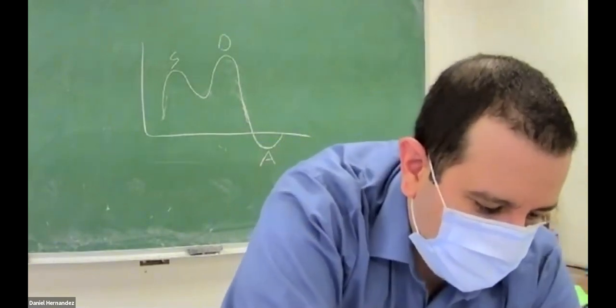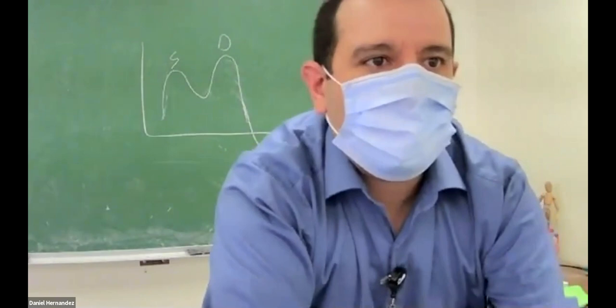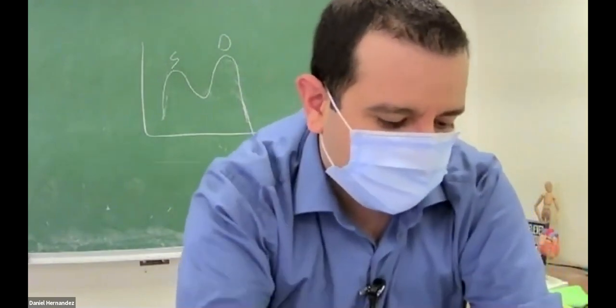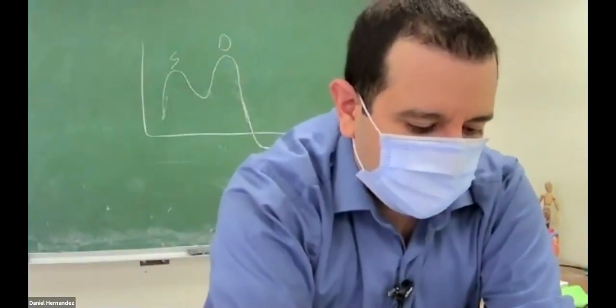So a ventricular aneurysm is when we have a wall that's become dyskinetic, a region of dyskinesis with abnormal contour. So we consider that ventricular wall aneurysmal.